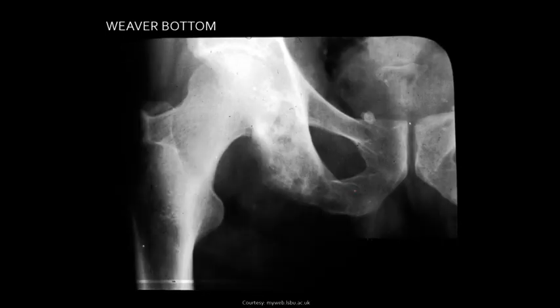And then a Weaver's bottom, we have this mixed sclerotic and lytic change seen in the ischial tuberosity. So the lytic change is more acute infection, and the sclerotic change is more chronic or subacute change. Tuberculous infection tends to have more chronic changes associated with it by the time it's found because it's never really that severe.